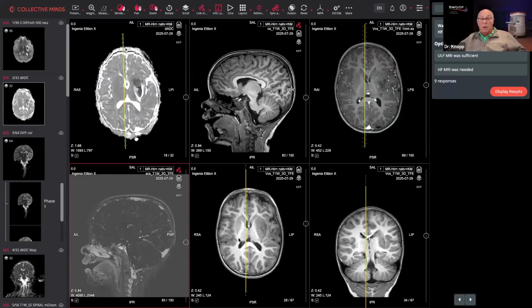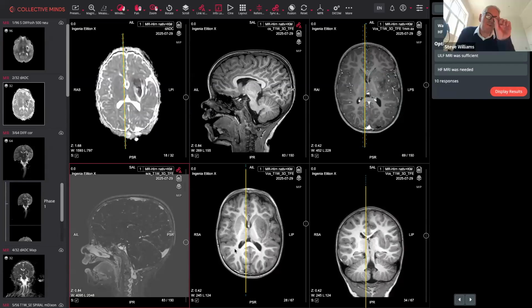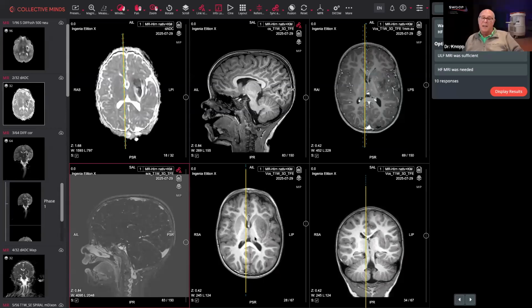In terms of the overall imaging appearance? I know in terms of the overall delineation of the pathology, because the T1s are sort of flatter at ultra low field, I just thought that it sort of came up and was more apparent, perhaps. I mean, definitely not less apparent anyway, put it that way. No, definitely not less apparent. Yes, I think these images are beautiful. So it's going to be tough for me to argue otherwise.